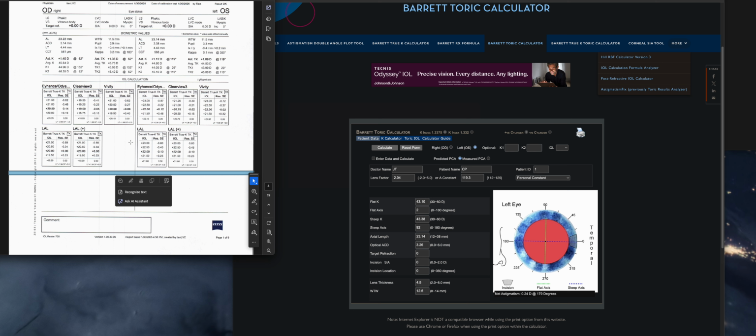In this patient, we typically do LAL for post myopic LASIK. In the past, I'd offset the two eyes, but I think we're probably not going to do that going forward. So, in that case, for this patient, we'd use LAL, 20 diopters, and LAL, probably do 22 diopters. Basically, just what the machine suggests. You can go a little hyperopic. RxSight likes you to do that, or you can go a little more myopic and give them a little better. It's an adjustable lens. No one's gonna fault you for either whichever way you want to go there. Just get adjusted out, and it's a great lens.